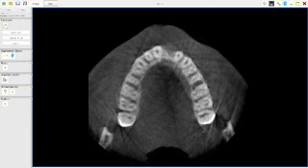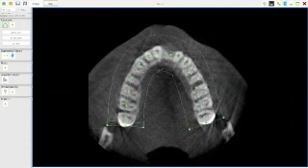Again, you press on this button here, and then you can start doing your points like that. We bring our pointer all the way around, carry on all the way down like this, bring that all the way to there, and when you come to the last part, just double click it like so. That then gives you a complete picture of the whole thing done.